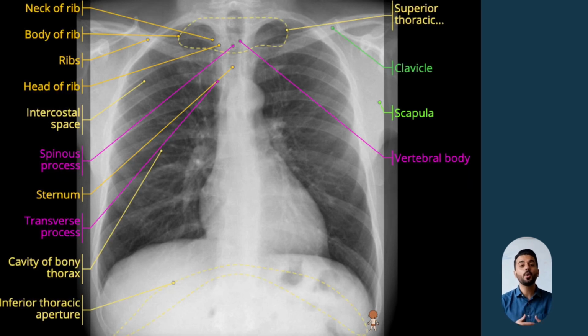Let us start with the bones and soft tissue, our skin and fat and stuff. In our system, these are the outermost structures. The first thing we check. Here are the ribs. There are 12 on each side. 7 connect all the way around, true ribs, and 5 do not, false ribs.